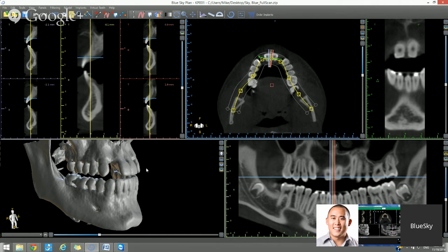The question just came in regarding importing the DICOM images. Yeah, I'm just going to review that very quickly because I see that a whole bunch of people joined a few minutes late. So I'm going to go back and review those settings very quickly.